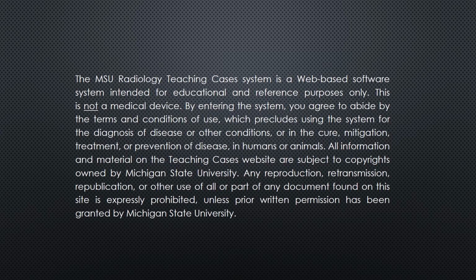To explore the database, open your favorite browser and go to teachingcases.rad.msu.edu. Before we dive in, the MSU Radiology Teaching Cases system is a web-based software system intended for educational and reference purposes only. This is not a medical device. By entering the system, you agree to abide by the terms and conditions of use, which precludes using the system for the diagnosis of disease and other conditions, or in the cure, mitigation, treatment, or prevention of disease in humans or animals. All information and material on the Teaching Cases website are subject to copyrights owned by Michigan State University. Any reproduction, retransmission, republication, or other use of all or part of any document found on this site is expressly prohibited, unless prior written permission has been granted by Michigan State University.